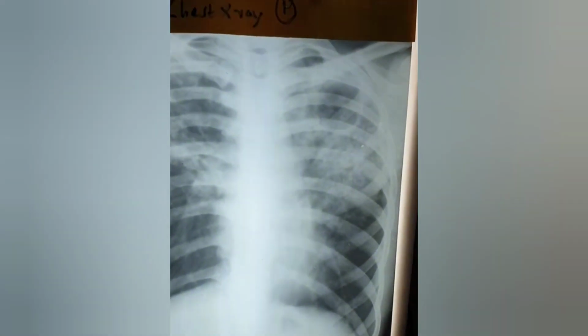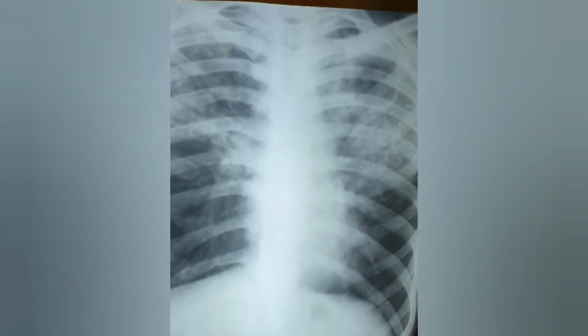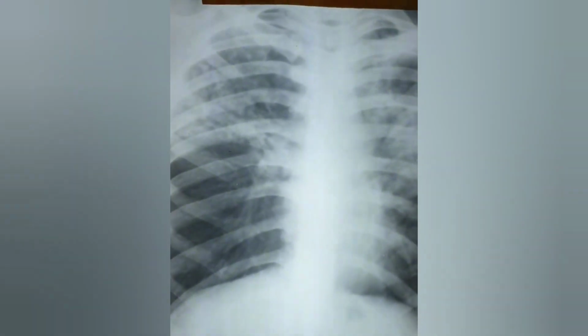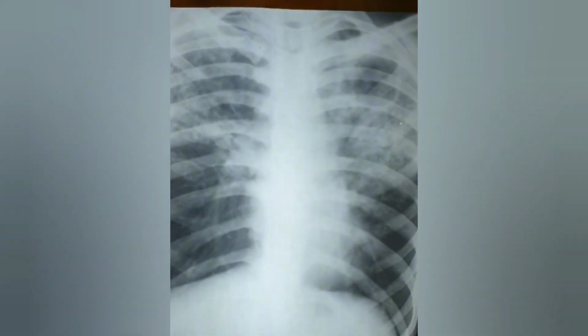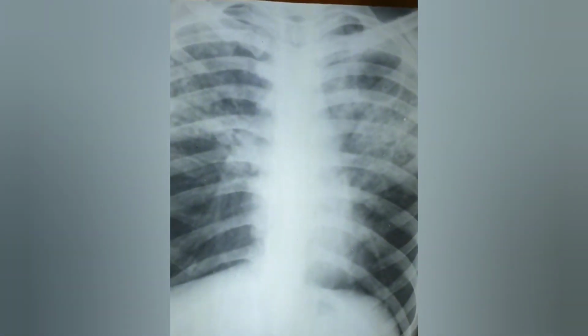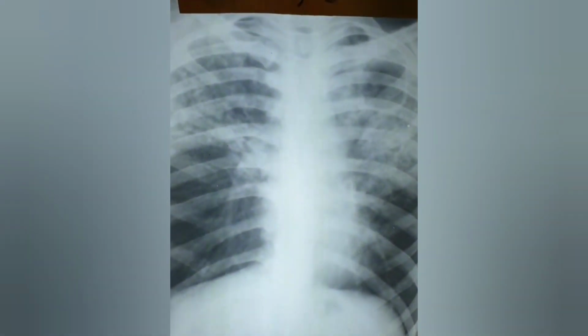So is this an abnormal X-ray? Whenever there is a lesion on both sides of the lungs, more in the upper lobe, infiltrative lesions and a cavity most likely suggest pulmonary tuberculosis. So the radiological diagnosis: both upper zones, infiltrative lesions, both sides of the lungs, and in the left upper zone you find a cavity. These are the radiology remarks. Strong possibility of pulmonary tuberculosis. So this patient needs sputum for AFB and other lab diagnosis.